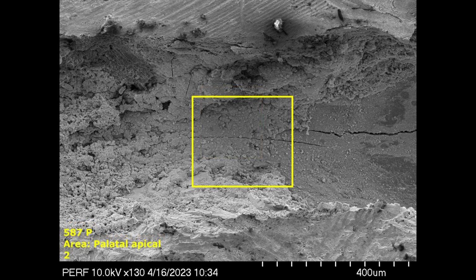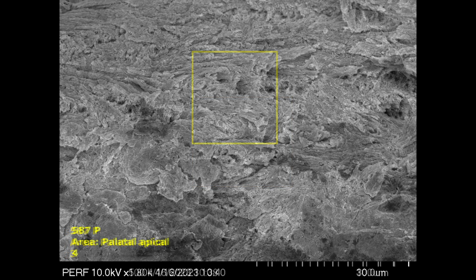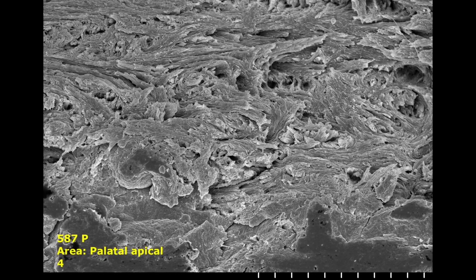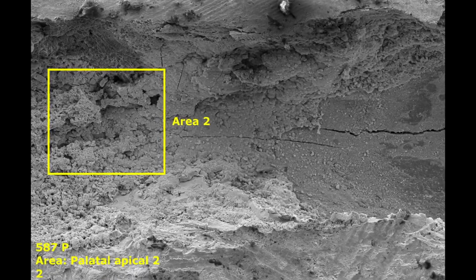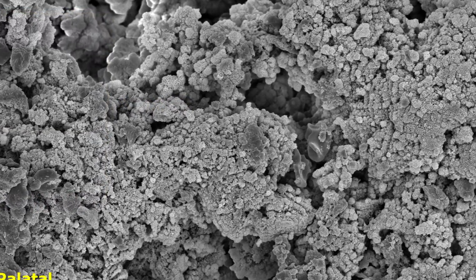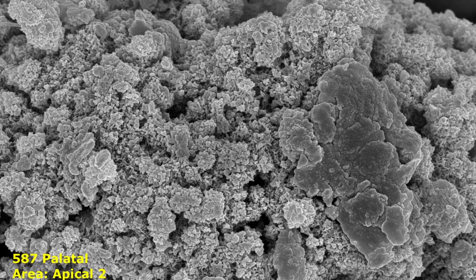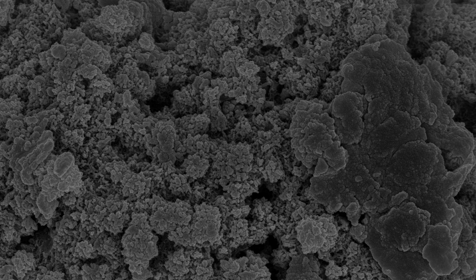In all of my examination, and I spent about 3 hours on this tooth, I did not find any evidence of bacterial contamination at all. Most of it was just very similar to this, instrumentation debris and smear layer debris. There you can kind of see the mineralized smear layer. Spend some time looking at these images, and then I'll take questions on the MIE forum, and we'll get into the nasty little details. Now, this is Pushpak's next case that we'll look at.